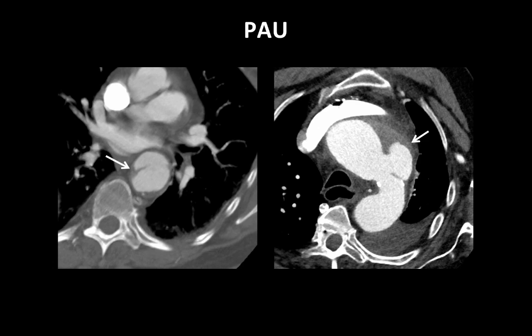And in distinction to the aortic dissections, these penetrating atherosclerotic ulcers are very localized. They're not always aneurysmal, but we do see a sort of a discrete neck between the true lumen of the aorta and this little outpouching where the ulcer has occurred.